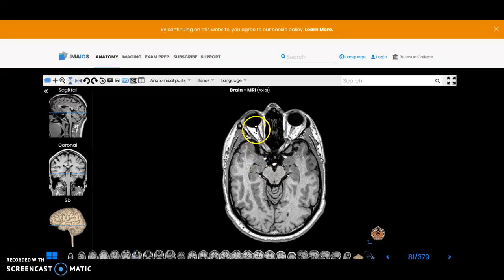We also have a little bit of fluid on the very top point of this cursor that I have, a little bit of fluid around the meninges. Remember that there is CSF fluid around the meninges, and that meninges surrounds this optic nerve. So you've got a little bit of dark fluid around there. The optic nerves travel posteriorly. At the same time they're traveling posteriorly, they travel superiorly, and we're going to see that in just a moment.